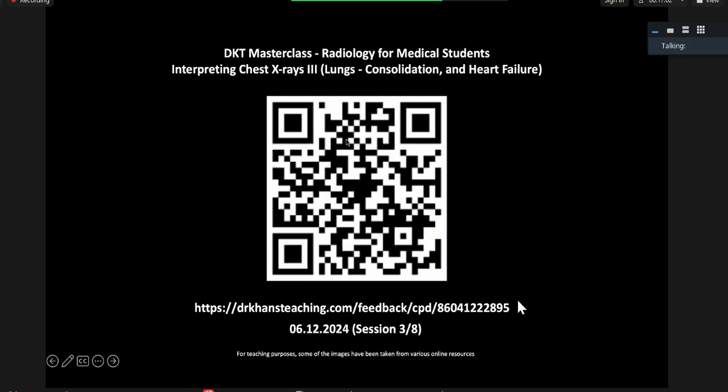On one side is interstitial consolidation of bat wing? No. Interstitial thickening, we say; consolidation is for the alveolar pattern. Is the pulmonary bat wing more interstitial consolidation on one side than the other? It's alveolar consolidation. Maybe I don't know which X-ray you were talking about. Whatever we saw about the bat wing was alveolar with ill-defined spreading edges. It might be more on one side. Both sides were abnormal, and on one side it was more, probably.